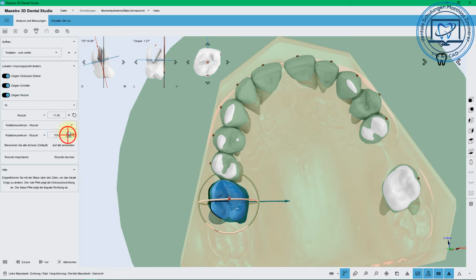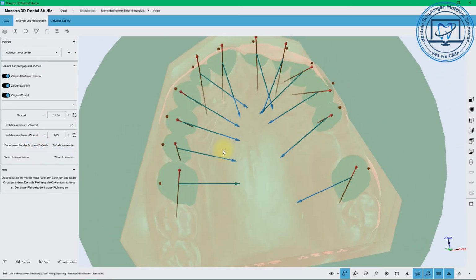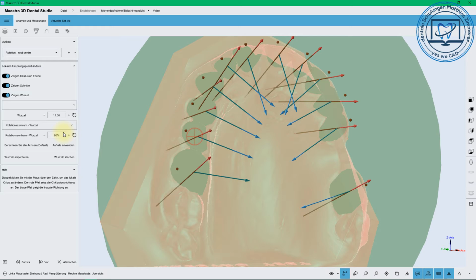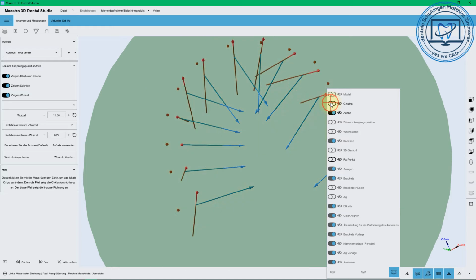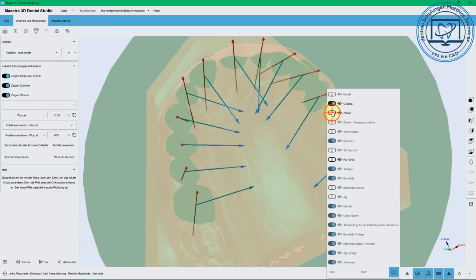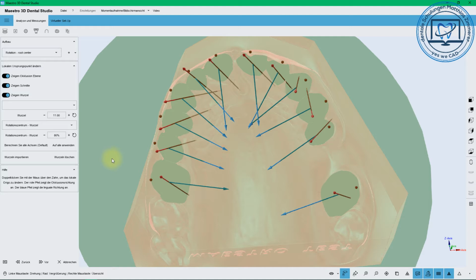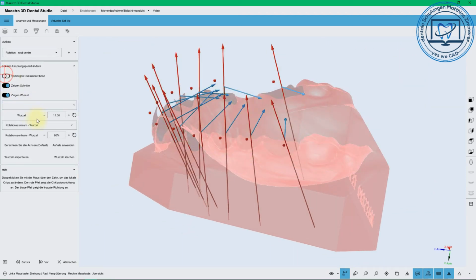Moving the roots, it is very necessary to know what you're doing there. If this is done badly, you will get bad results. The best would be to have an OPG, then you can measure it, or a CBCT. It sounds easy with CBCT, but it isn't. If you have bad CBCT DICOM data, then you normally have not much chance to extract the roots, and the roots would most of the time not come out the best.